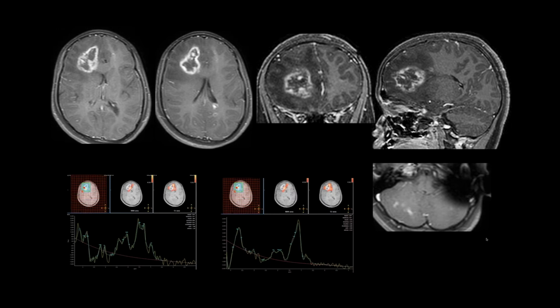Before you go, how would you read that spectroscopy? The spectroscopy shows a large lipid lactate peak, reduced NAA, creatine is reduced. Does the lipid lactate appear at 1.3? At 3.6 there is a large peak, but I don't know if this is a short TE. I'm assuming it's a short TE, and that could be a possible trehalose peak. Yeah. So basically, showing a lot of necrosis, isn't it?